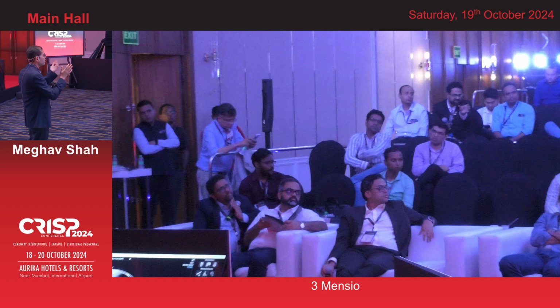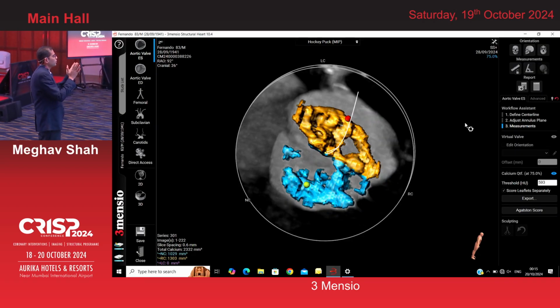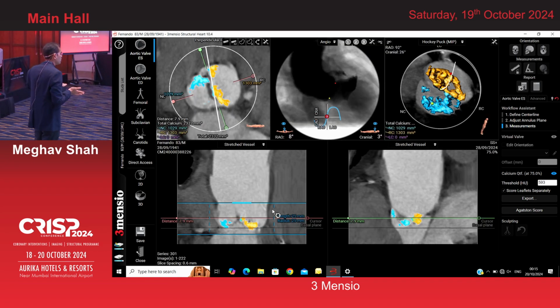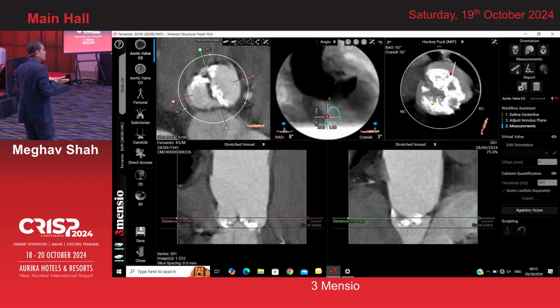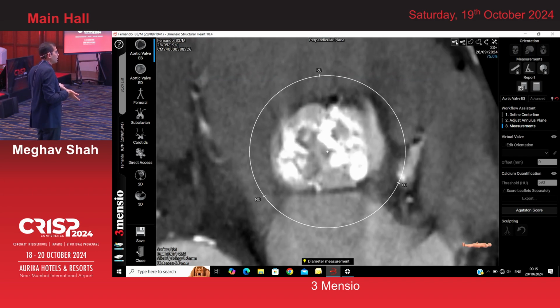No, one question that I have is, you can have bicuspid. So this is in general. Now let's assume, usually in bicuspids, the narrowest area is supraannular rather than at the annular level. So in those cases, it's preferable that you do a 100-0 placement rather than an 80-20 placement.